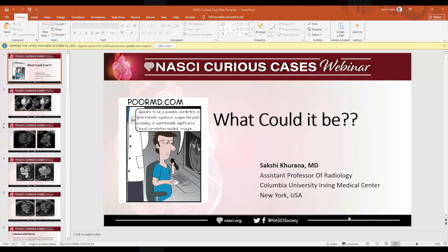So, with this information, the patient was sent to us for cardiac MR to evaluate what's going on and what is this echogenic mass that they were seeing on echo within the right ventricular cavity. So this is the axial bright blood image that showed that there was a mass-like thickening.